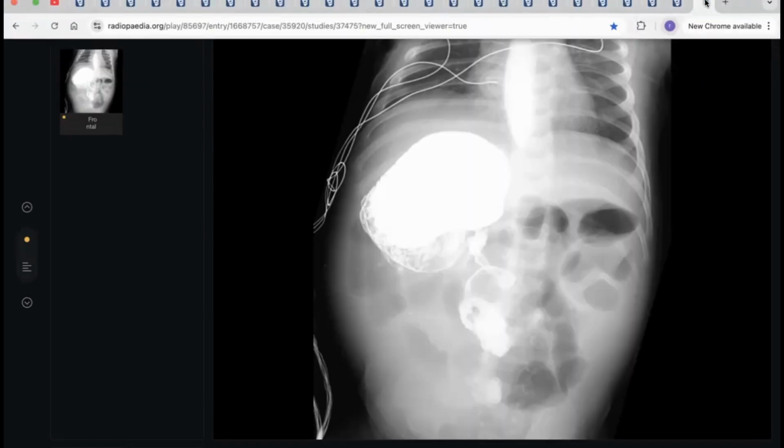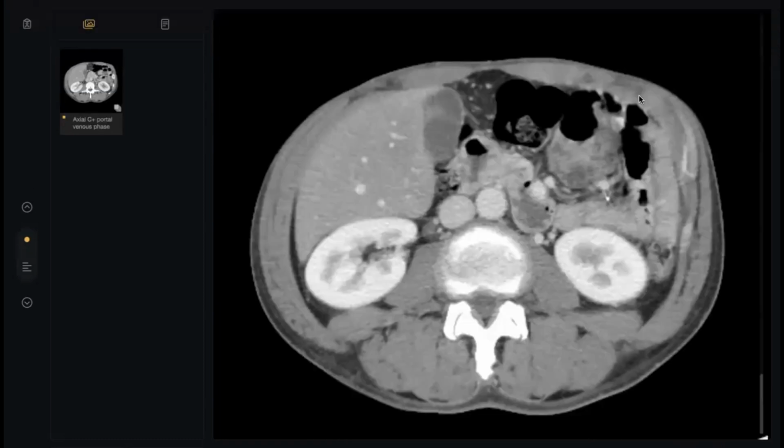Next candidate. Doctor, there was also a stomach rotation as well. Yes, gastric volvulus, acceptable. The stomach is a little bit on the right side and this is abnormal. Okay, fine.